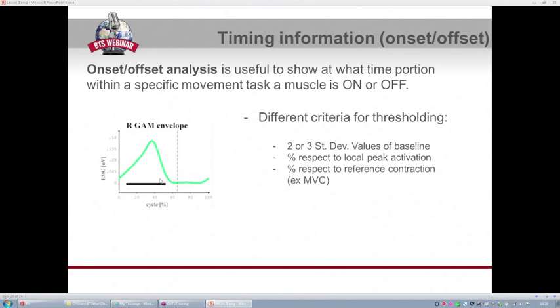The most popular approach to compute the threshold that has to be used is to compute the standard deviation range of the EMG baseline before a certain activity, or, for example, to consider the average activity during the resting.